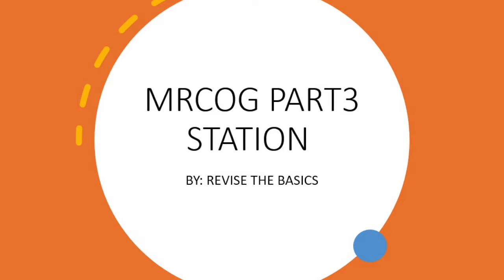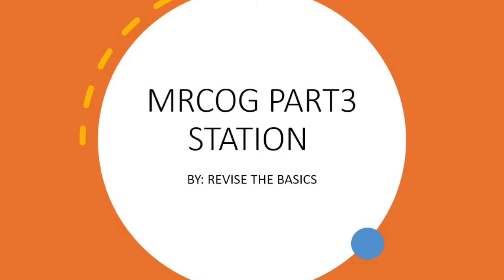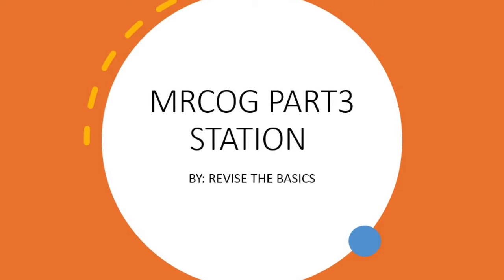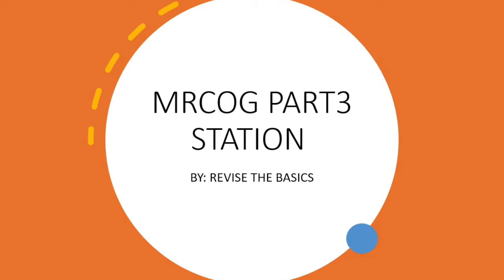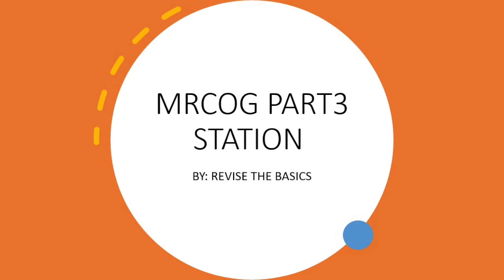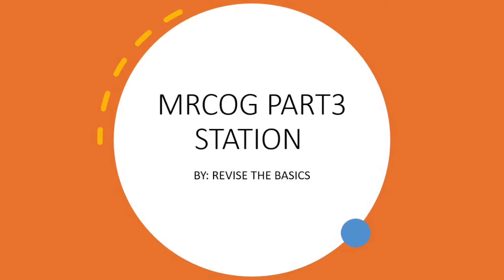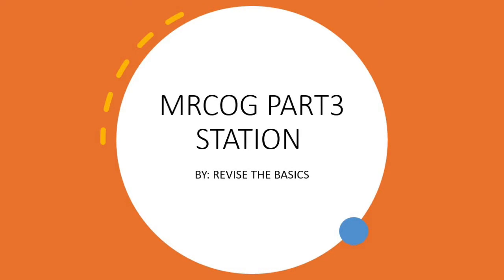Today I thought I will go through a very popular MRCOG Part 3 exam station with you. This is talking about different surgical instruments that are used here in the UK, and this station has come up a lot repeatedly in MRCOG Part 3 exam. So I hope you'll benefit from this as we're going to go through all the different various instruments one by one.